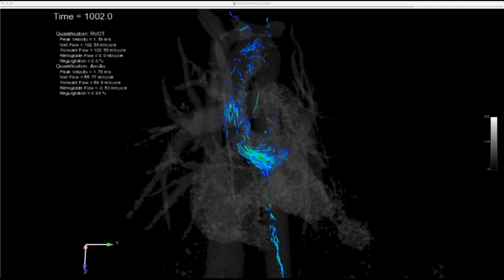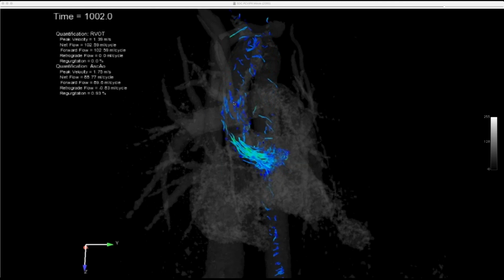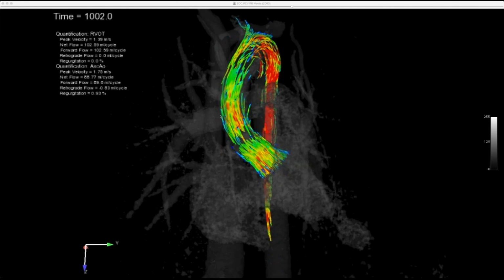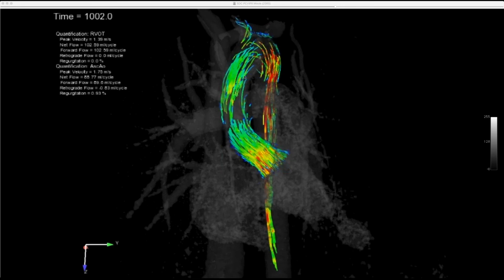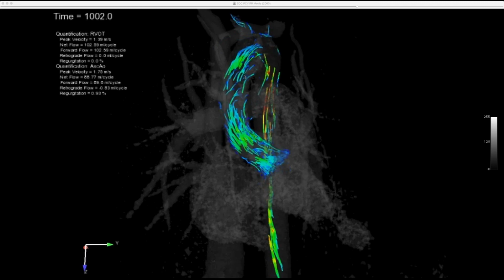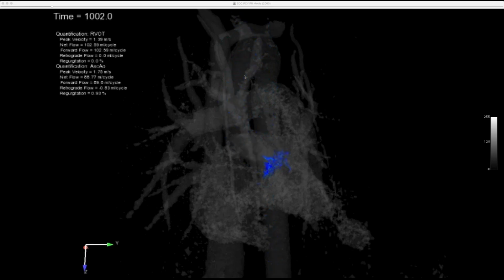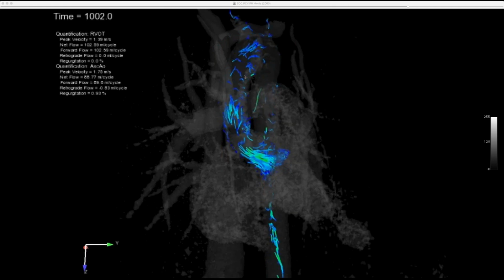Apparently it has a different impact on the aortic wall stresses, and you get more dilation when you have that off-center flow jet. So the first patient I showed is more likely to have dilation of the ascending aorta because of the stress on the wall, whereas with laminar flow the forces are more evenly distributed, and the aorta is able to cope with this. So this is one way to decide the timing of surveillance for aortic dilation, as well as echo looking at the valve.